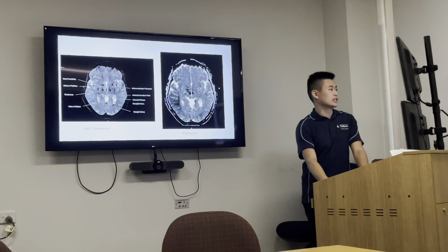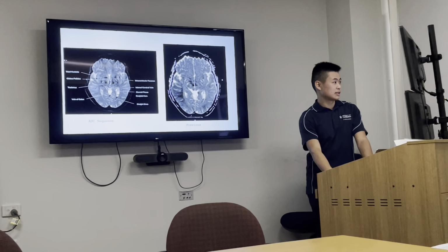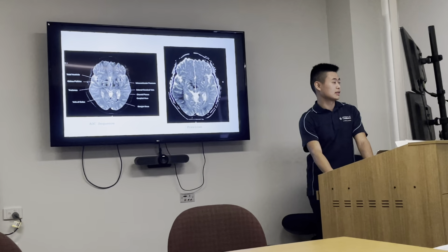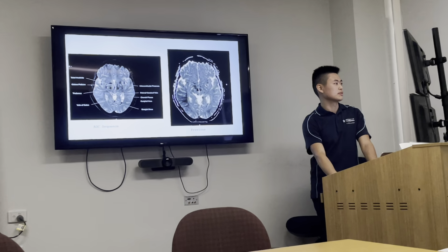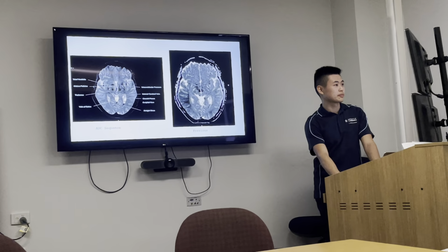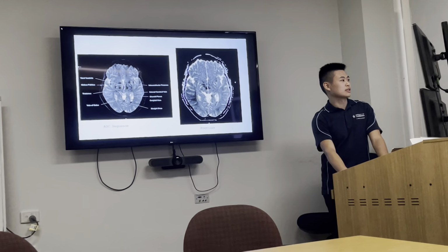So this is actually from the patient, anatomy. You can see the choroid plexus, everything up there. Little lesions, usually from the catheter that passes through there. And look at the previous as well. There are some minor changes just up here.